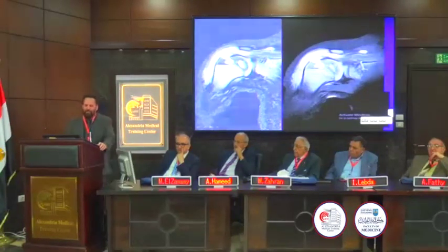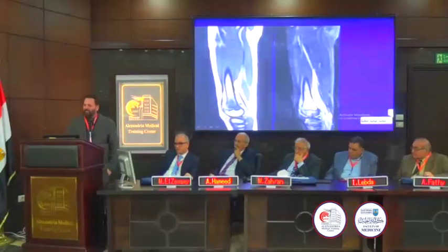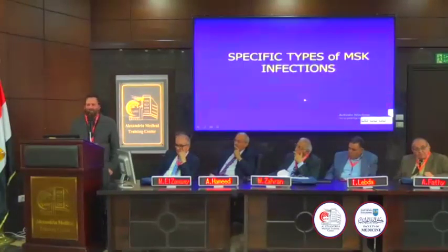So here's an infant with osteomyelitis of the epiphysis, which wasn't even fully ossified. We see the small area of ossification there. Here is a child with metaphyseal osteomyelitis, periosteal reaction because they have loose periosteum. So children will get subperiosteal abscesses and periosteal reaction, and adults will tend to get neither. Here's an MR of a different patient, but same age, metaphyseal osteomyelitis.